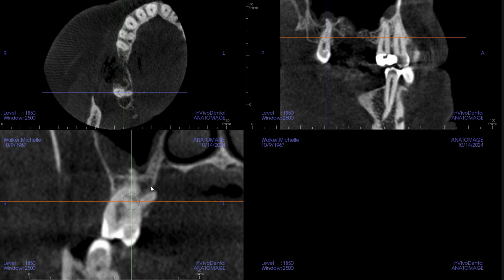With that said, this really makes a lot of sense. When we look in the sinus here, this root does extend into the sinus, and we have some Schneiderian membrane reaction to what's going on. This might be some mucus buildup, but based on the fact that this image here looks dome-shaped around the apex of the tooth, I'd call this a sinus inflammation of odontogenic origin, just based on the fact that it's symmetrical around the apex of the tooth. Same with this guy right here, not surprising considering we have this right there.